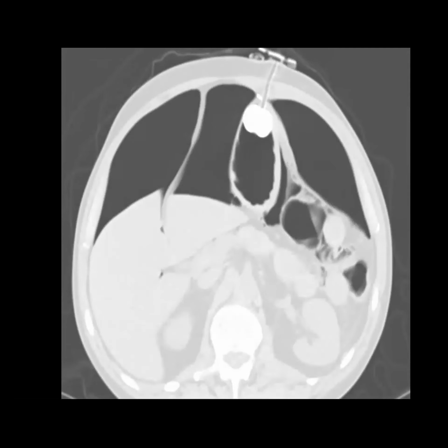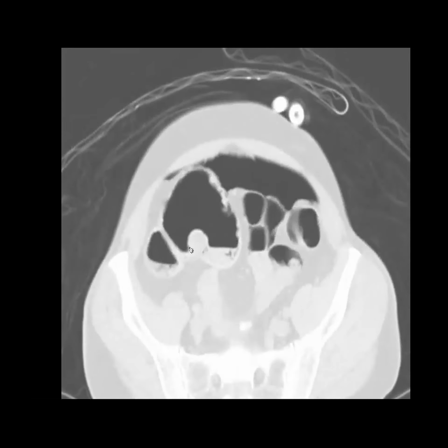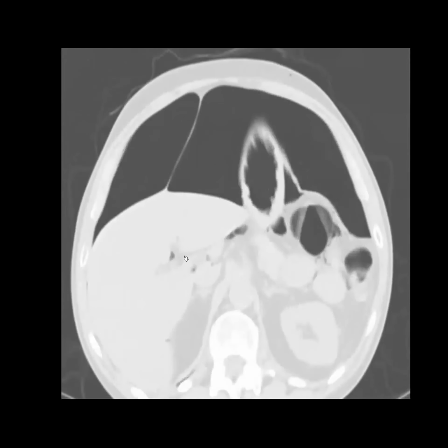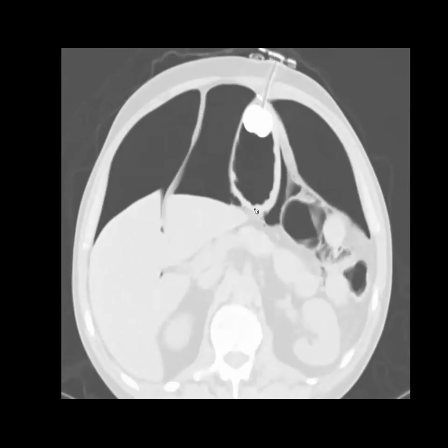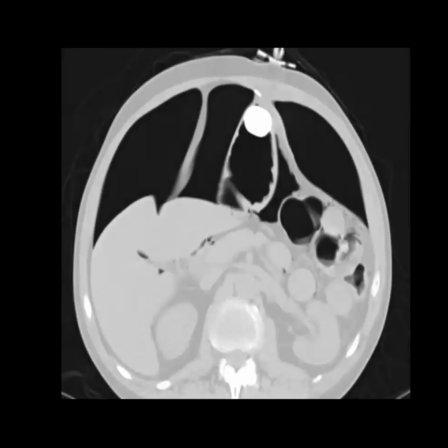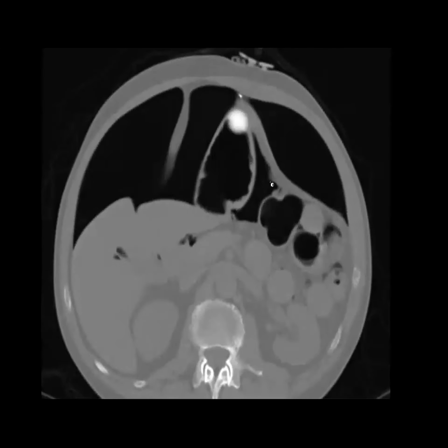Yeah. Okay, so what do you think, Teresa? And that's never an appropriate post-surgical or post-G-tube appearance. So I will tell you, I've seen cases. Have you seen this post-surgical? Well, I've seen it in the immediate post-surgical setting, and usually the patient's asymptomatic. So I've stopped being as worried post G-tube. I think it's because, especially when GI does it, they insufflate the stomach, right? And then they push it up to the surface and then they put a needle in it. And so basically all of that air that they use to insufflate the stomach suddenly goes out into the peritoneal cavity. 6 days post-op, we thought maybe this is definitely too much.